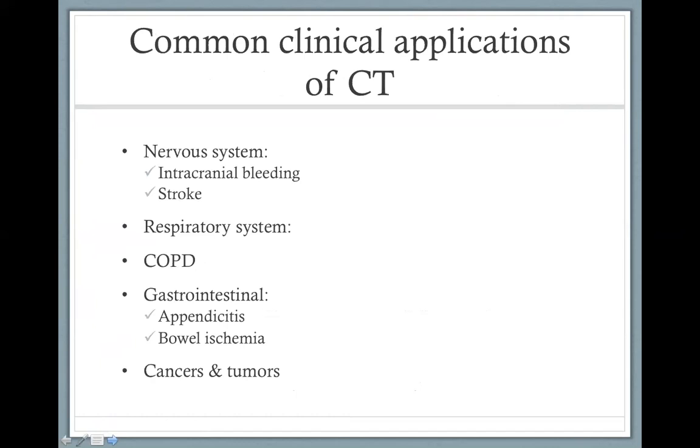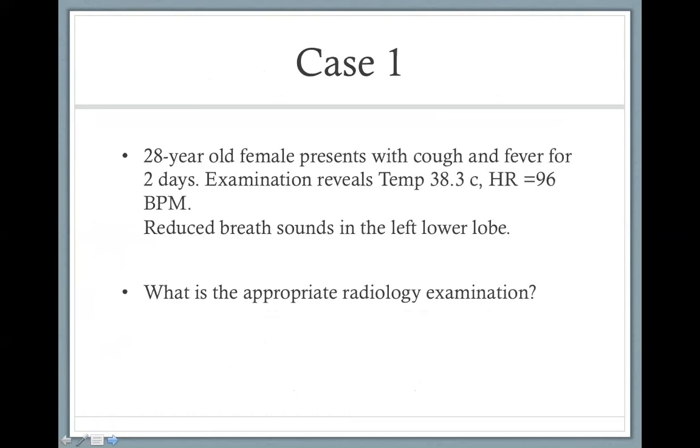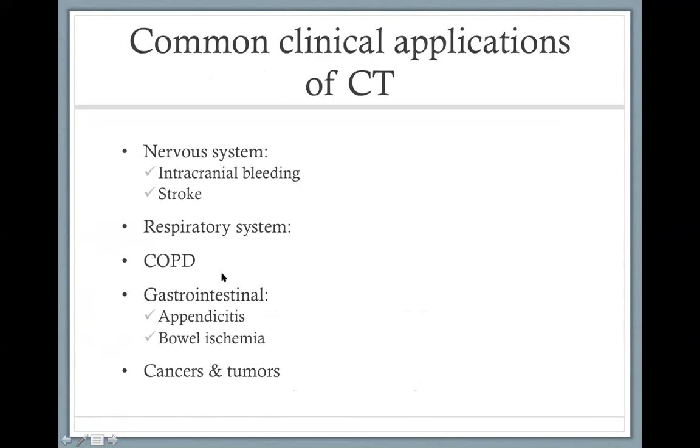I will show you more cases, but just as a wrap up for now, the common clinical applications of CT in the brain: intracranial bleeding and then stroke. I have shown you an example of an intracranial hemorrhage, subarachnoid in this case.